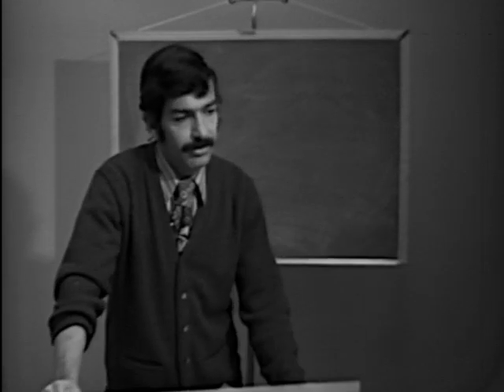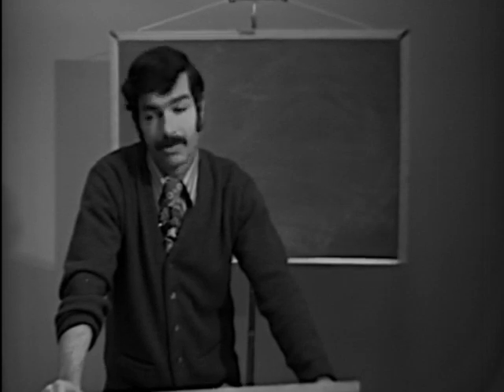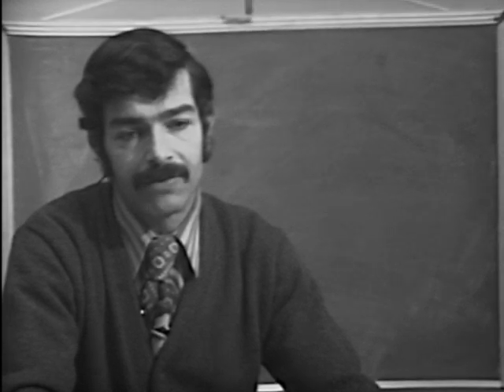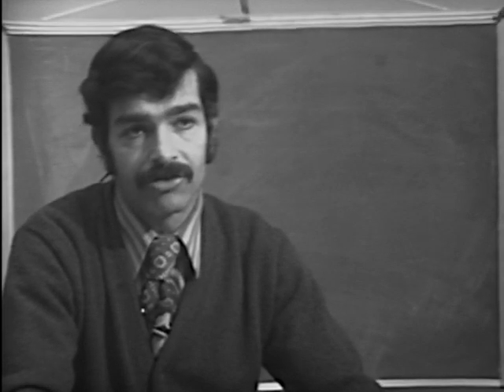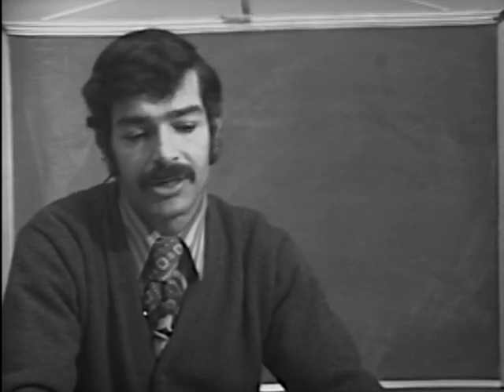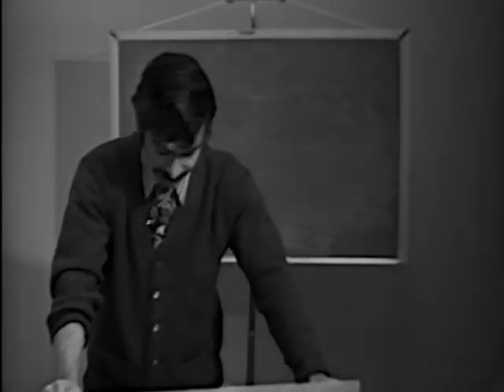Okay, T waves. Now, as a rough rule, we can say in a frontal plane, when we're talking about the frontal plane, leads 1, 2, 3, AVR, AVL, AVF, that the T waves should generally be upright in every lead except for AVR. Now there are certain exceptions to that, and I'll talk about that when we talk about positions of the heart, but as a rough overall guideline, every lead in the frontal plane should show an upright T wave, perhaps except for AVR. But we'll talk about exceptions.